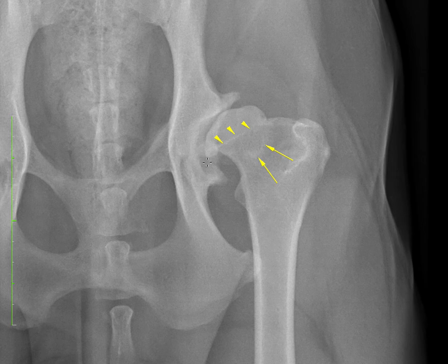So although we don't need to be super specific when we have this substantial of degenerative changes, it's a nice example of the difference between osteophyte and enthesiophyte. There are some places where we could use both terms. So for example, on the edge of the hip here, although this is a bone cartilage junction, there also are some joint capsule attachments on the acetabular margin. So osteophyte and enthesiophyte can be used specifically where possible, and in other cases, the term periarticular new bone formation is more than sufficient.